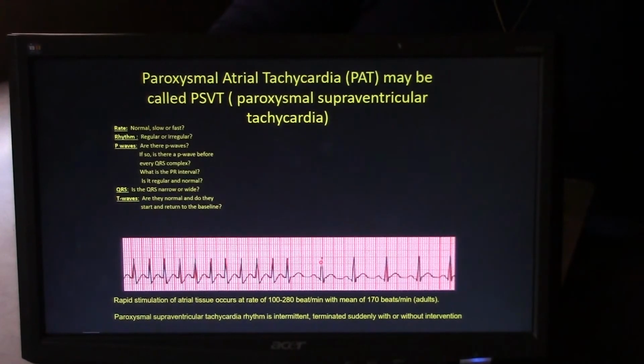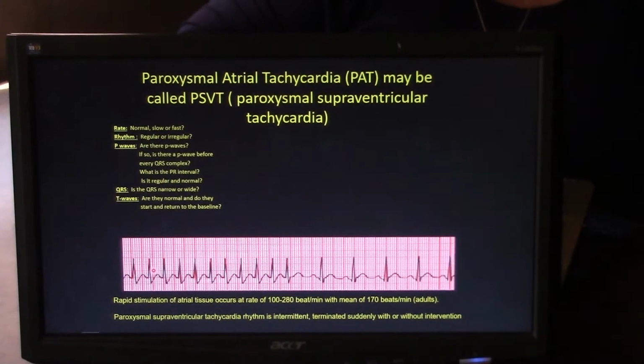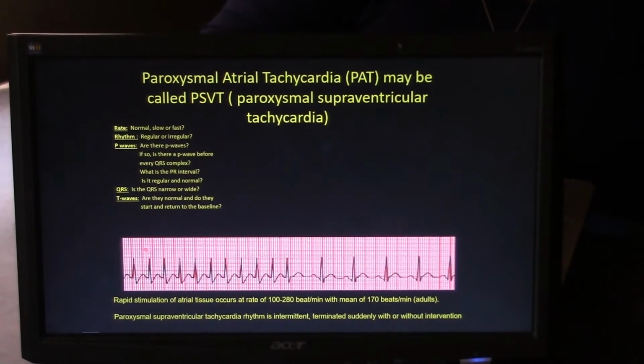Let's take a look at that. 300, 150, 100. I'm sorry, you have a heart rate of 100, not 75. So that would fit normal criteria. On this end, though, look at this. 300, 150. It's greater than 150 because it starts again right before this line. So that gives you a heart rate of around 180. So in the dysrhythmia portion of this rhythm strip, it is very fast.